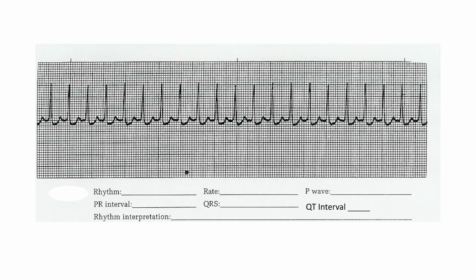Your QRSs are normal, so if you do measure your QRS, you're going to measure from the beginning of the QRS, and then again, this has a little bit of ST depression, so it's kind of hard. So you would kind of get, it looks like about 2 blocks. Some of them look even smaller, maybe 1 box, so it's 0.04 to 0.08. The QT, if you want to call that a QT, would be to the end, and that would be about, looks like 0.24.